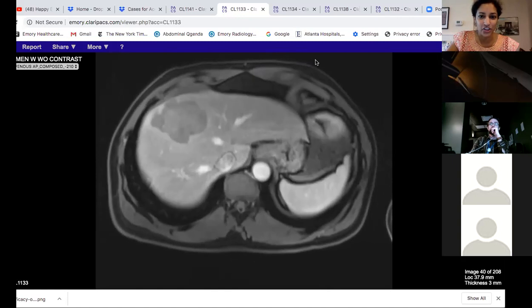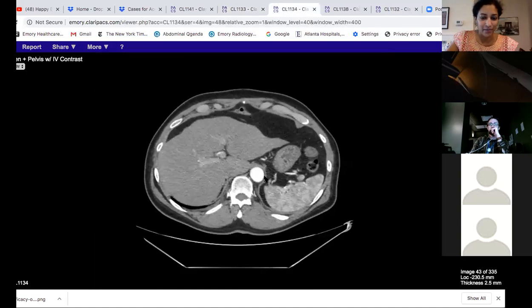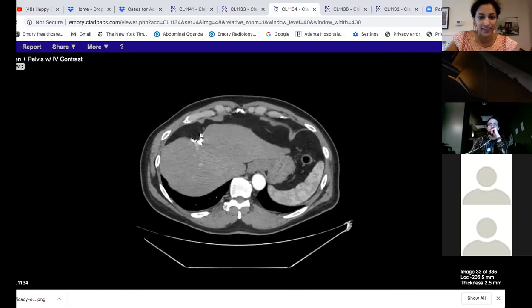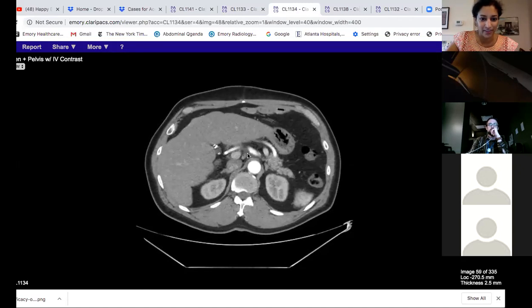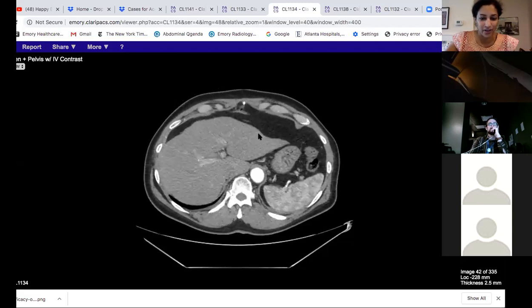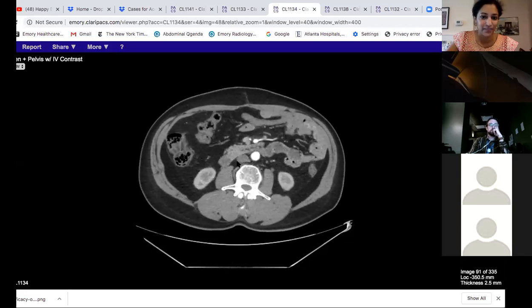So the patient got resection and came for follow-up. This was their follow-up exam. We did a biphasic exam. You can see that that big met has been resected. There are a couple of other stable lesions, like a cyst here, and they had another resection over here. We're not seeing that much in the arterial phase, but one caveat is that this is a very early arterial phase, so we're not getting good enhancement of the liver. We're not in the hepatic arterial phase yet.